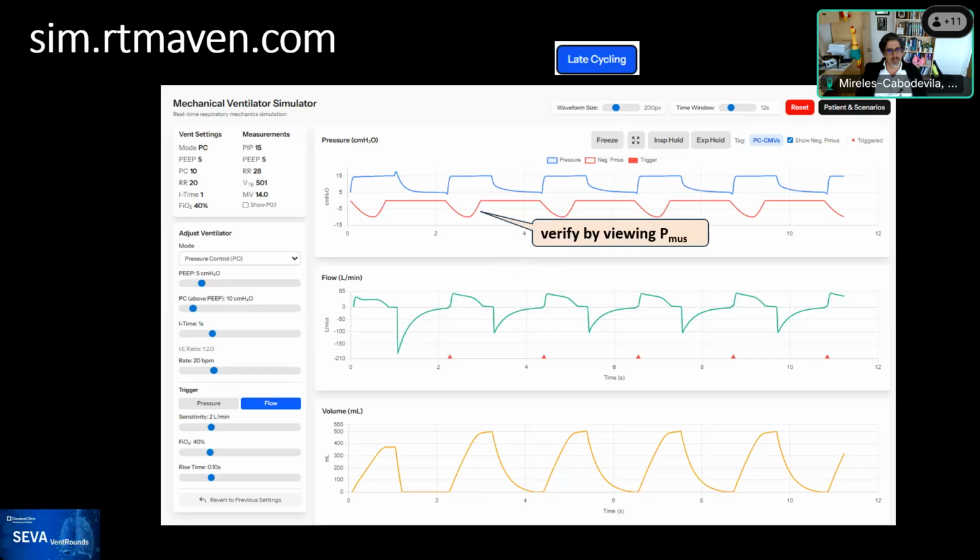Some ventilators close the valves, actually. Some of them keep them open. So sometimes this may lead to a concern of, is the patient actually making an effort to exhale, or is this just relaxation of the muscles? So this is a little bit more nuanced. And as you start seeing the waveforms, the reality is that this has a lot more noise than what this one shows there, Rob.